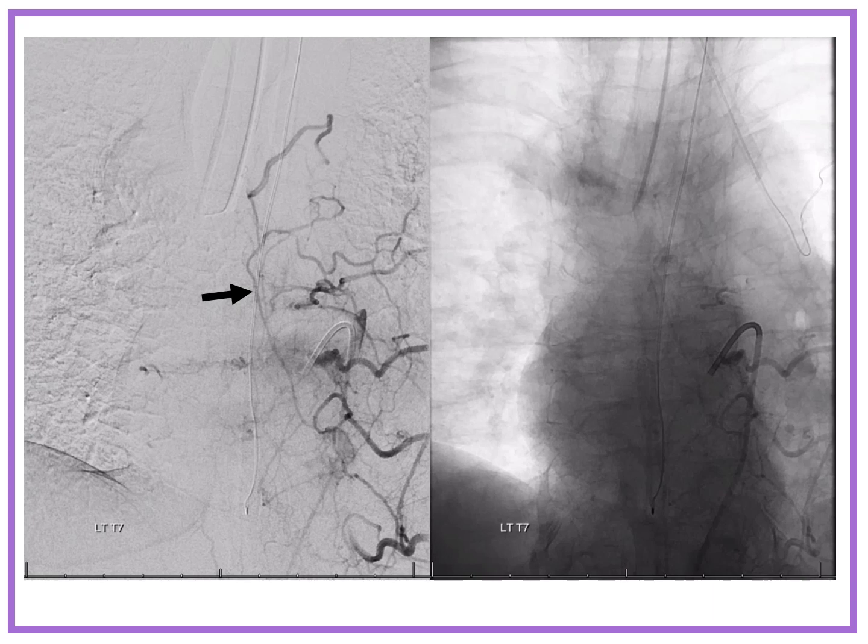There's a lot of very interesting variants and a lot of good anatomy here to know in general before we get into the meat of our discussion. So here's left T7, for example. Always image the native image as well as the digital subtraction image, just so you know where you are, in case a level is missing someplace.